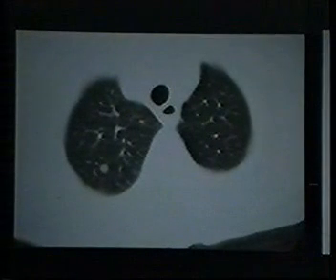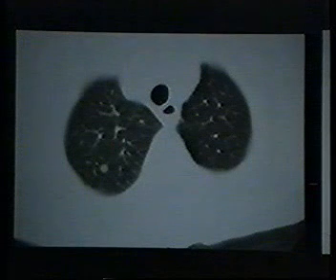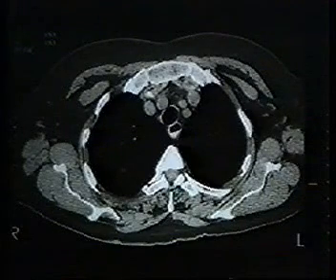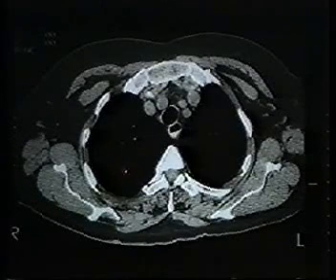This is a patient we have seen recently, a patient who presented with a nodule in the upper portion of the right chest. Here is a scan with 1 centimeter collimation, and here a scan with 1.5 millimeter collimation. Again, this is the kind of scan we will need to use if we are looking at nodule density. Looking at this nodule again with thin collimation, we can see that the nodule is very low in density and looks actually like subcutaneous fat.